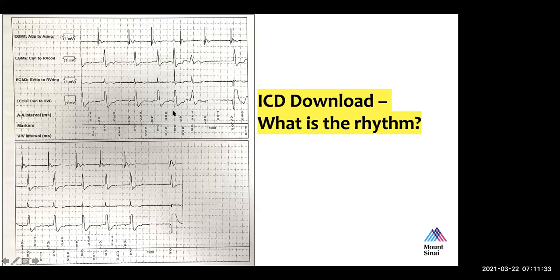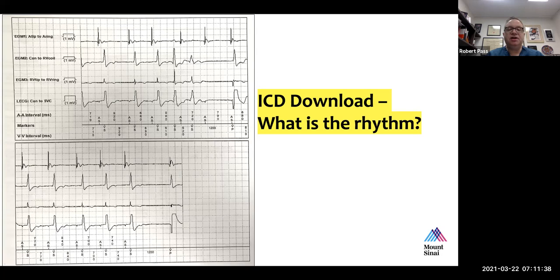I agree. So this is an example of a patient who is having PVCs in sinus rhythm. And just interesting that the patient has such a burden of PVCs that we are actually seeing it in the presenting electrogram. Also, interestingly, if you look at the bottom of the tracing, what's going on here?